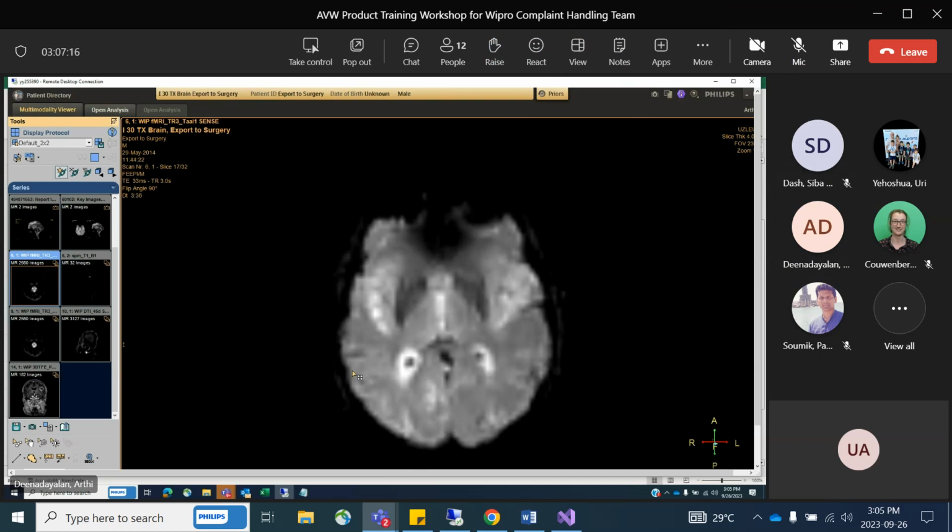Yes. So this is how you will verify. There are more than 20 dynamics, and that is why I was able to load the series, and this is a valid series.